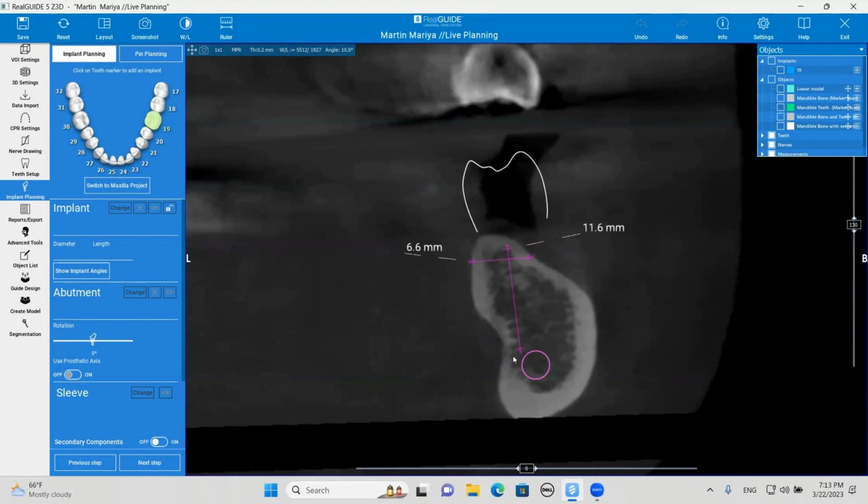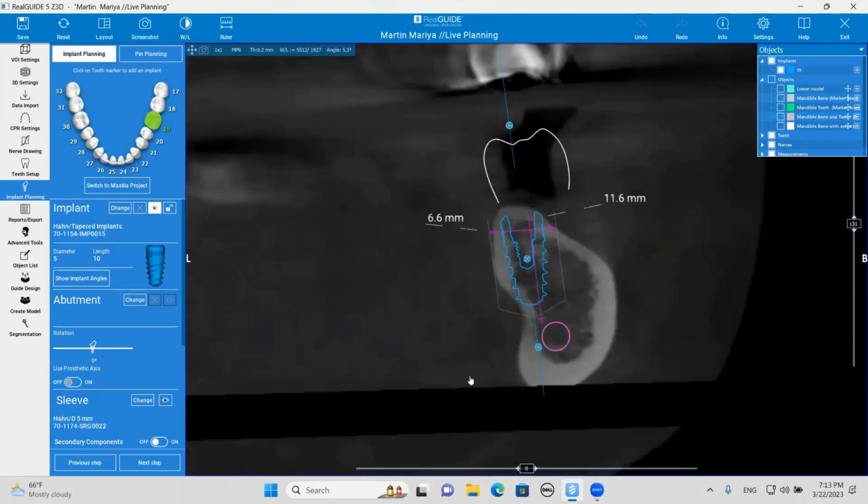So Hussein, have you put an implant in on this case? Oh, you have? Okay. So that looks like it's a 5x10. With that being said, as I said, there's a little bit of a lingual undercut there. Well, actually a pretty significant undercut.